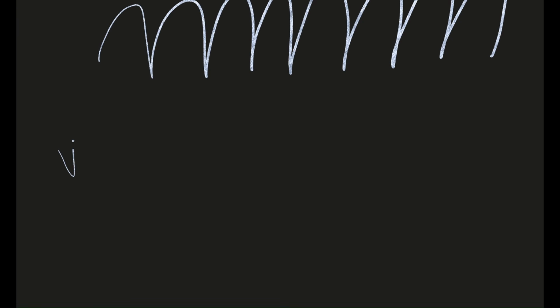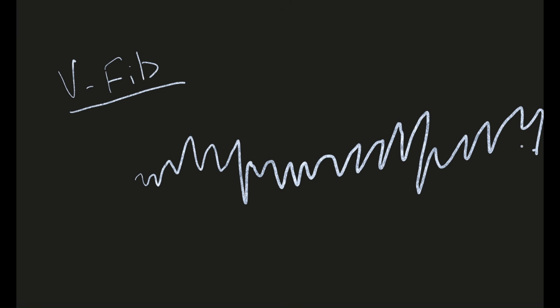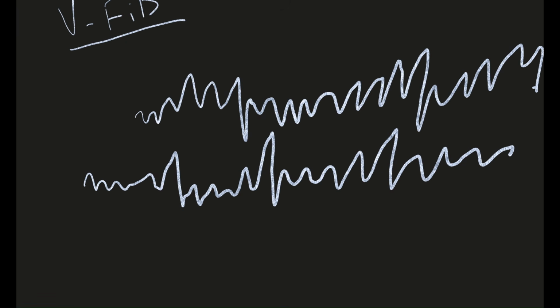So moving on towards ventricular fibrillation. Usually ventricular fibrillation is pulseless, and you will find a haphazard pattern. The QRS complexes will be varying in amplitude, varying in rhythm, sometimes small like this. This is fibrillation. The QRS complexes will be bizarre.